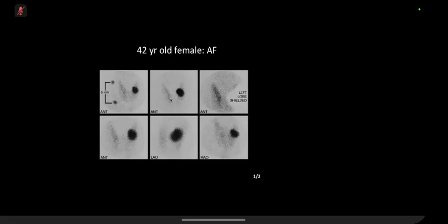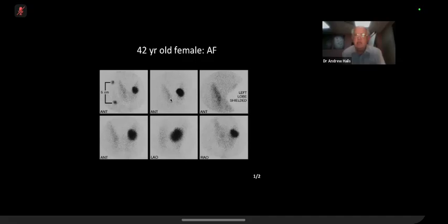Could that one nodule be suppressing the rest of the gland, so there's not as much relative uptake in the rest of it? Yes, that's quite right. That's really what this is designed to show. We've got the markers here showing it's basically a normal sized gland, 5 centimetres, but there's very little uptake except in this toxic nodule.